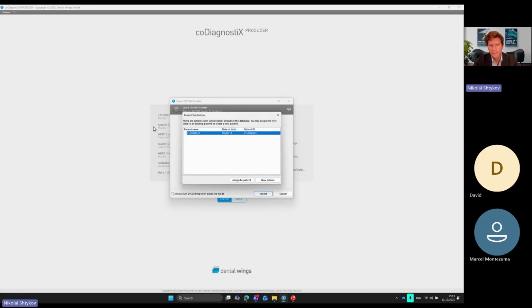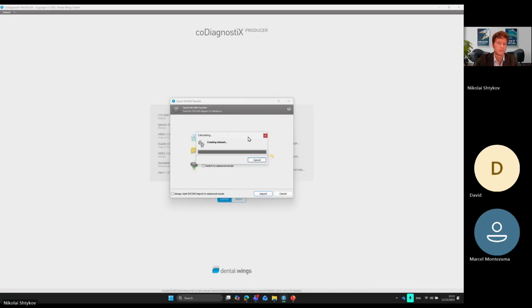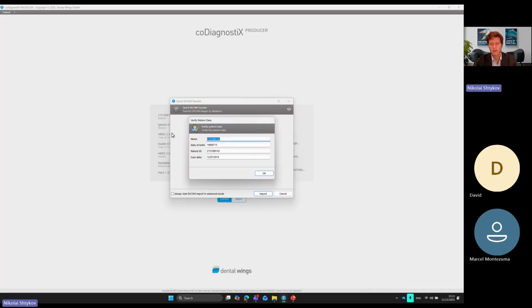And here, because I preloaded this case before, the system recognized that I have the same patient name, and maybe this is the same patient, and I can assign it to that patient or create it as a new patient. Let's start as a new patient. And we can rename this.